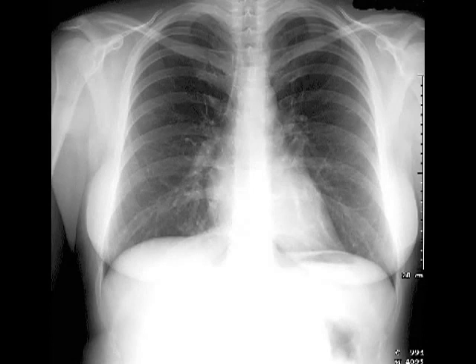Want to learn how to read a chest x-ray? Well, good. This is a skill that a good respiratory therapist should have. Now, we're not trying to make you a radiologist, but after you've looked at about 1,000 chest x-rays, you'll be pretty good at knowing your way around them. So I would recommend getting started looking at your 1,000 now so you get there quicker.